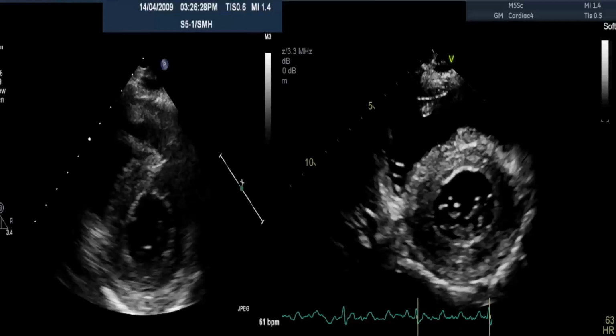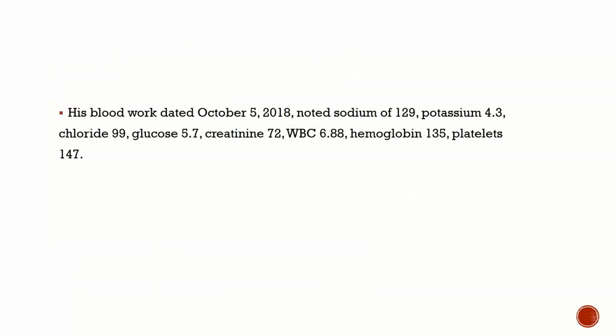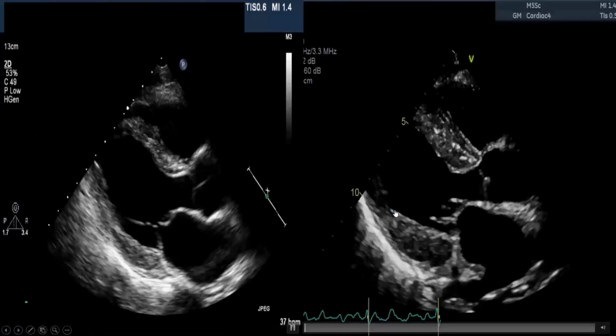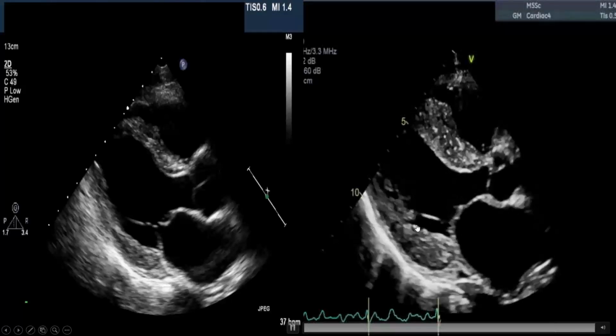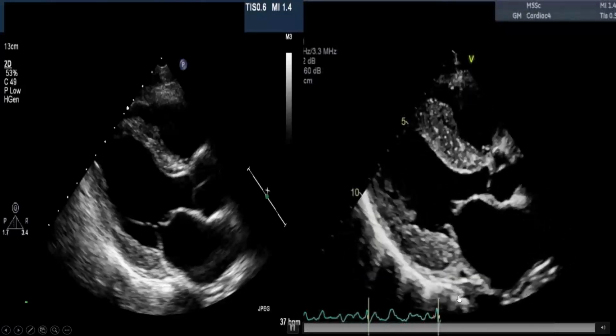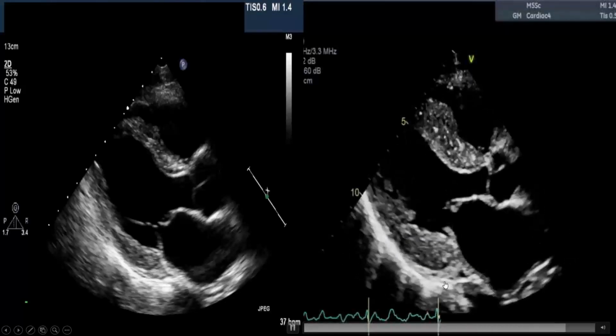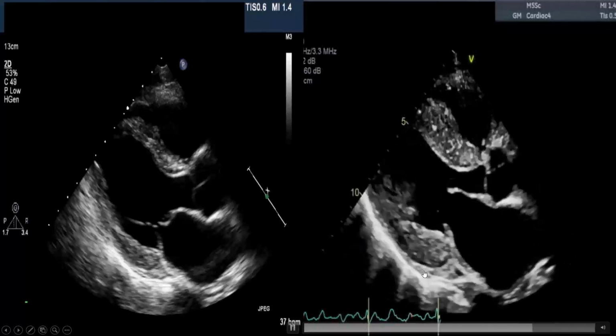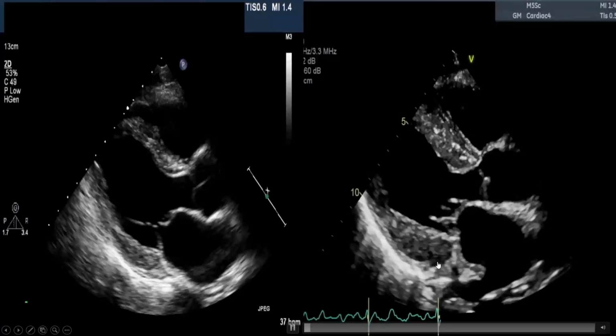Thanks. I think it was clear that this is cardiac amyloidosis. Although this patient was asymptomatic, let's go back and look at the features of cardiac amyloidosis here. From the parasternal long axis view, you can appreciate, firstly, that the pericardial effusion is not well seen in this image, although it's well seen in other images. We can look at it later on.